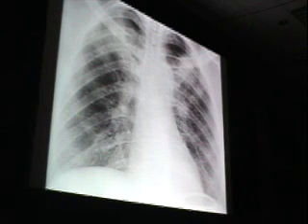Okay, next case. Now we're looking at a case in which, again, we see a diffuse reticular nodular pattern. Actually, the nodule may be more apparent to you here. But notice as you look at this that there's, again, a tendency toward an upper lobe predominance of this disease. And an upper lobe predominance is particularly helpful because there aren't as many diseases that do that. We've talked about tuberculosis, and this is the pneumoconiosis, and silicosis in this case.